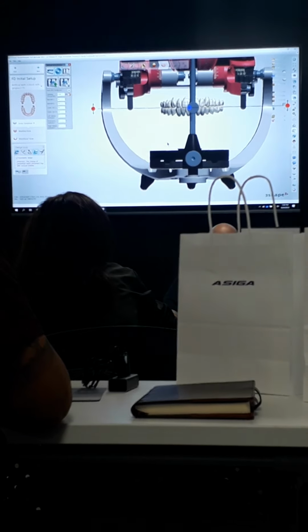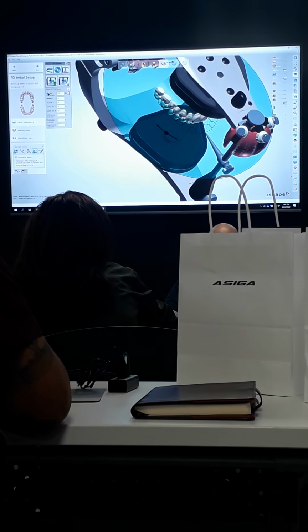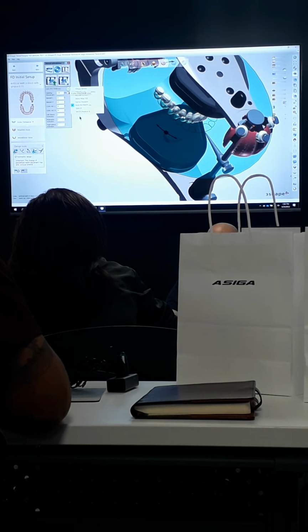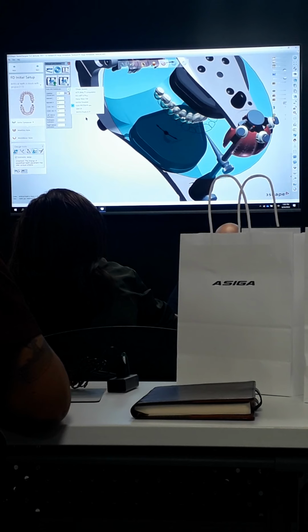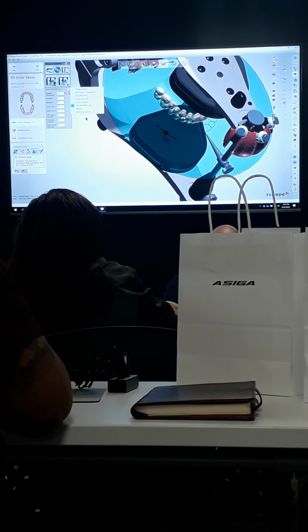And there are multiple different articulators that you can choose from. So you'll see right here that I have, this is the Cavo, but if I drop this black arrow down here, I have multiple other ones I can choose from. There's only two things that really factor into the one that you choose here. It's whether or not you've used a transfer plate to scan this in. Transfer plates only work on the lab scanner. And how much adjustment you want to do.